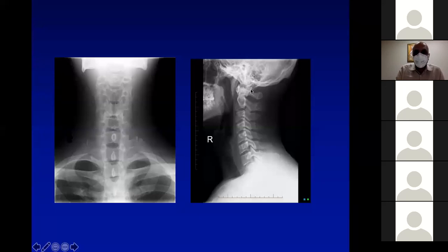There are a number of lines you need to identify in cervical spine X-ray, and these are curved lines. If you draw a curved line from this margin, as the cursor indicates here, I'm trying to draw this arbitrary line, you would see that there is a smooth curve in the cervical spine. The second line is along the posterior margin of the vertebral body. Again, this is a smooth line. The third line is along the anterior margin of the vertebral bodies, right?